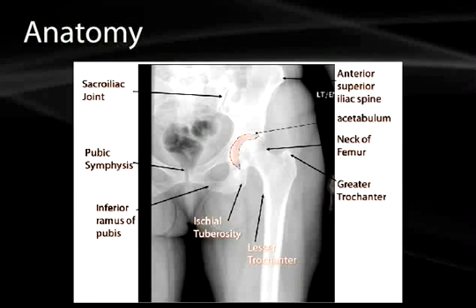And then of course the shaft of the femur itself that you can see anteriorly looks nice and thick. There's a good cortical bone. It shouldn't be too lucent. That can be a sign of osteoporosis or degenerative change. You wouldn't want to see a big density inside of that either, because this could be an indication of an osteosarcoma, because they oftentimes will associate with the long bones of the limbs, especially down towards the knee.